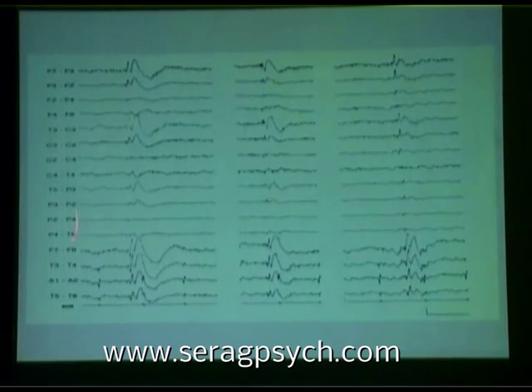So F7, F7, F3, F3, P4, P4, T5, T5. There's an exception here, A1, A2, you don't see it the second time. No montage is perfect, but you need that repetition, okay? So, yeah. Anyway, and then you notice the difference between the ECG here and the spike.